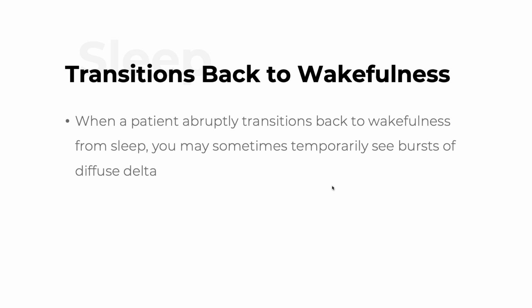So hopefully that makes sense with REM sleep and the other stages of sleep. This is one of those topics you do have to invest some time in, looking at enough EEGs to recognize these patterns. I think the more you understand how they fit in the context of the overall EEG, the more you'll avoid being tricked by a mimicker.